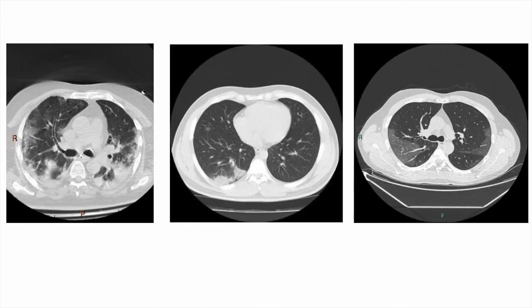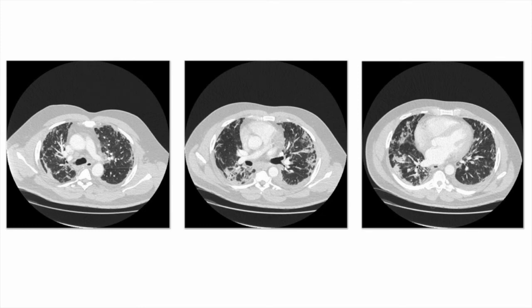So this is a sample of one patient with ground glass opacities. You can see they are bilateral, peripheral, and basal. Always remember that. And this is another sample of this disease, for the 4th stage. We want to see these fibrous stripes. The fibrous stripes produce these bronchial dilatations. So when you see a patient with post-COVID syndrome, that's what we're talking about. The CT scan looks like in this case.